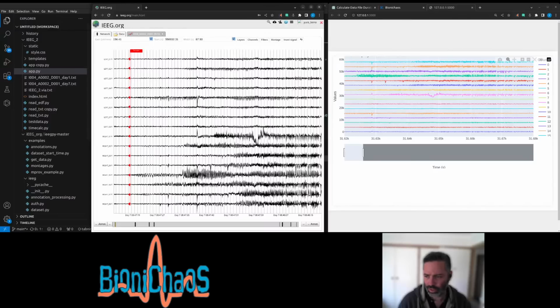Seconds, but it's actually still seconds. It should be a day number. I'm just trying to do several things at once, trying to figure out which one.